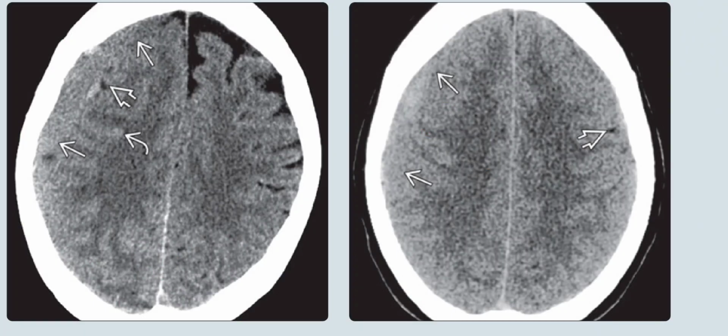The axial non-enhanced CT scan on the left side shows a right subdural hematoma that is isodense with the underlying cortex. Also noted is inward displacement of dots of CSF in the compressed underlying sulci. The gray-white matter interface is buckled inwards compared with the normal-appearing left side.